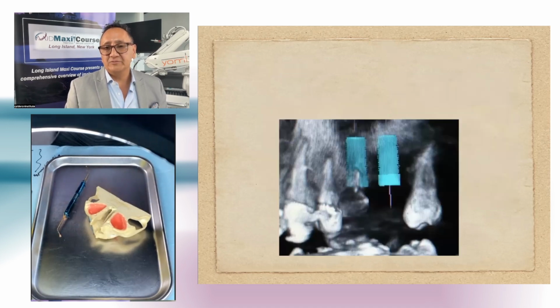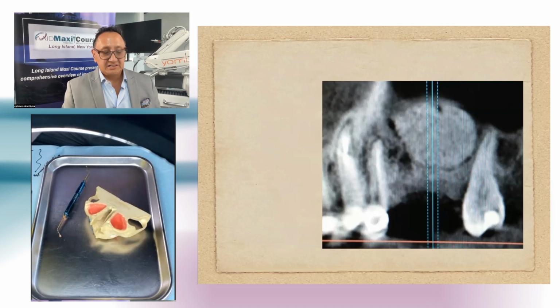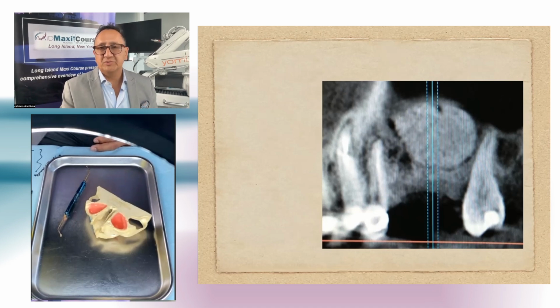So this is the plan with an older CAT scan machine. This is our sinus that we did there. It looks like we did a lot, but I know if I'm going to do a sinus lift, a lot of times doctors will tell you, oh, you just have to put a 10 millimeter implant. But if I can control the height of the sinus, because I'm going to do a lateral wall anyway, I like to put a longer implant, 11 and a half, 12, whichever your system allows. But there's no need to put a 16 millimeter one in that, okay? So you're going to raise it probably about 12 to 14 millimeters because you always get some resorption.